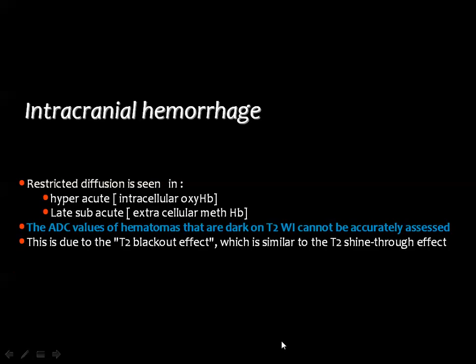Then we came to the intracerebral hemorrhage, and sometimes they said that whenever you are dealing with hemorrhage, which is clearly seen by CT and also by MRI, the diffusion weighted images will disturb your interpretation. And you can see here this statement, which is good also. Some of the hemorrhages will appear very black or very dark on the T2 weighted image.